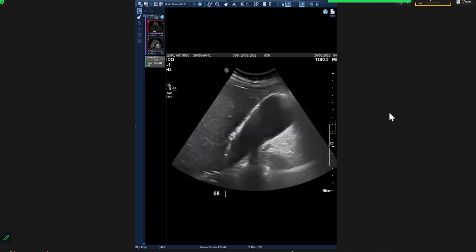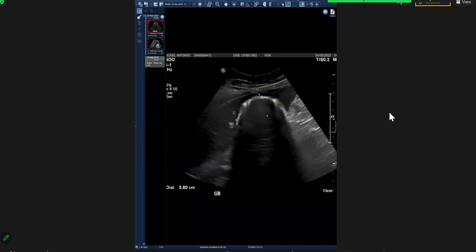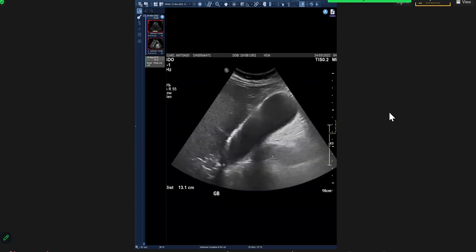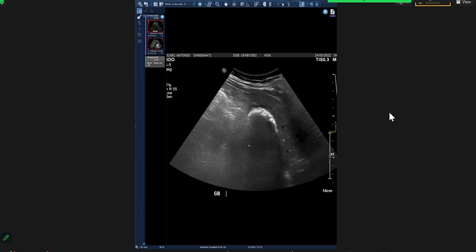These are the ultrasound grayscale images of a patient who presented with right upper quadrant pain. In these images, I want to look at the gallbladder. I feel that the gallbladder is significantly distended. I can see that its wall appears echogenic, causing posterior acoustic shadowing. And in one of the images, I felt there are a few foci in the wall. Can you scroll it?